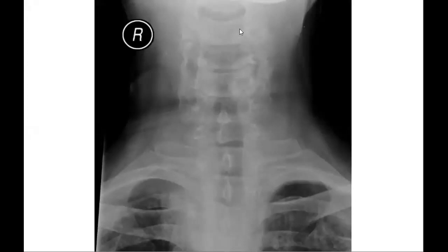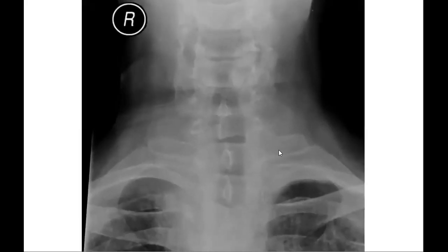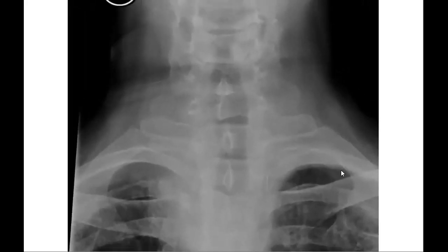When you search in the cervical spine, search for any fractures, clavicle, then check the ABCs of the lung. So here you can see this rounded area in the apex of the lung, but half of this rounded area is involved by a mass. This could be what is called a right apical mass, Pancoast tumor.